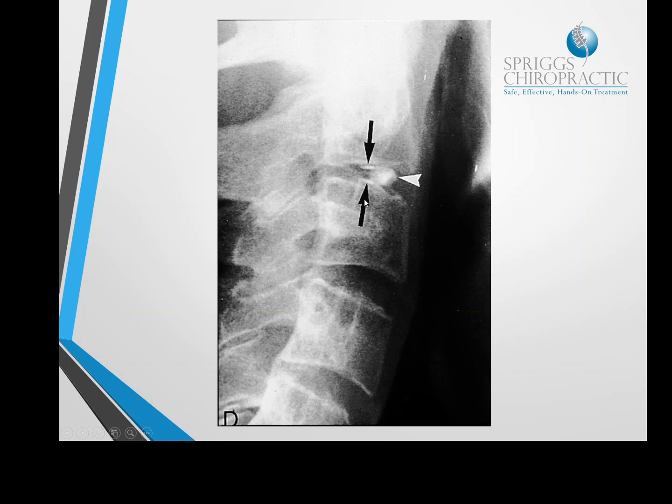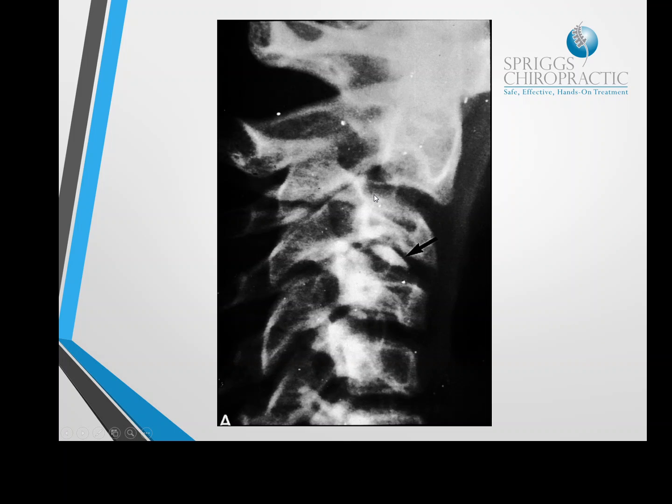Here we have calcification of the annular fibres as well. So this is the intervertebral disc between C2 and C3. You know, this very large calcific body that's occurred just here as well. Here it is in the peds case, where again we've got calcification in the intervertebral disc of C3 and C4. This is an immature skeleton as well. You've got very short and long looking vertebral bodies.